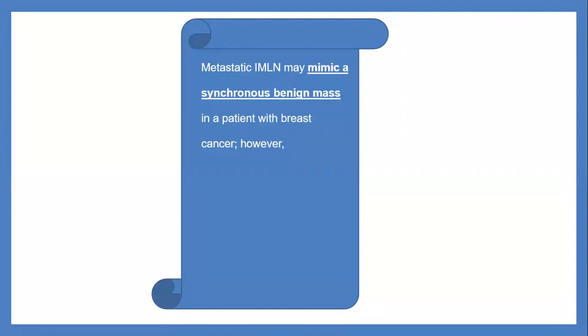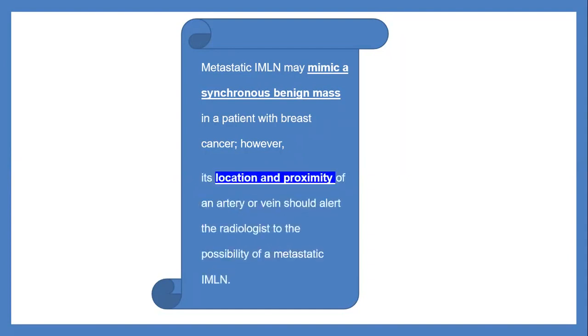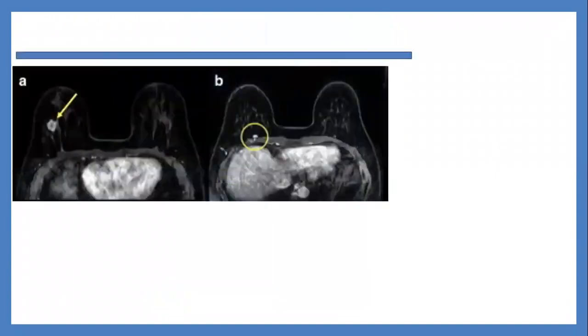If there is no fatty hilum, just to emphasize the same point, look at whether there is any adjacent vascularity. Usually there is a vessel adjacent to the intramammary lymph node. Okay, who's going to take this case? So far, so good.